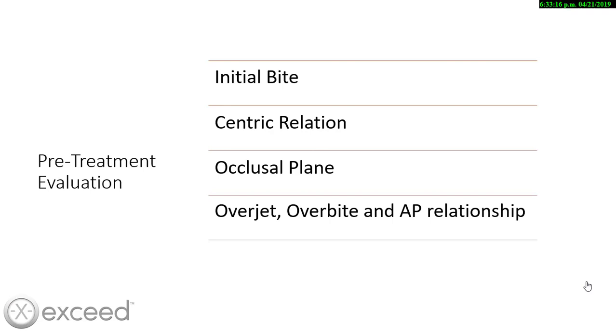So remember that the first thing and the most important thing that we are going to do when we first open a case is to always verify that that initial occlusion is just the same as in the patient. We can use the photos for that.